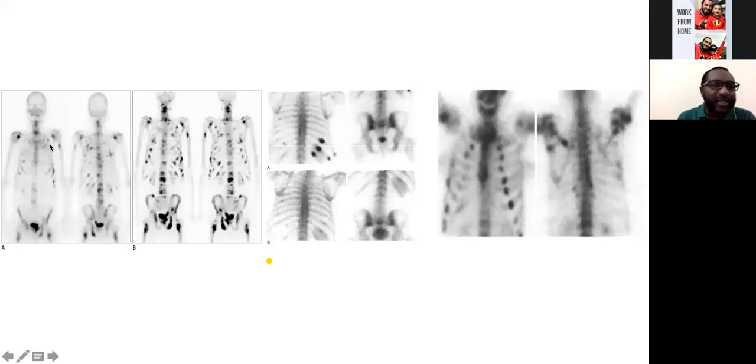All right. If you look at this patient, you'll see that there are multiple abnormal increased uptake involving bilateral ribs, anterior and posterior. You can see them, they are elongated. This shows you that these are metastases. If it is trauma, it is usually arranged in linear fashion. If you see lesions in the costochondral margin, these lesions are mainly due to metabolic bone disease. Metabolic bone disease like hyperparathyroidism, like renal osteodystrophy or osteomalacia.